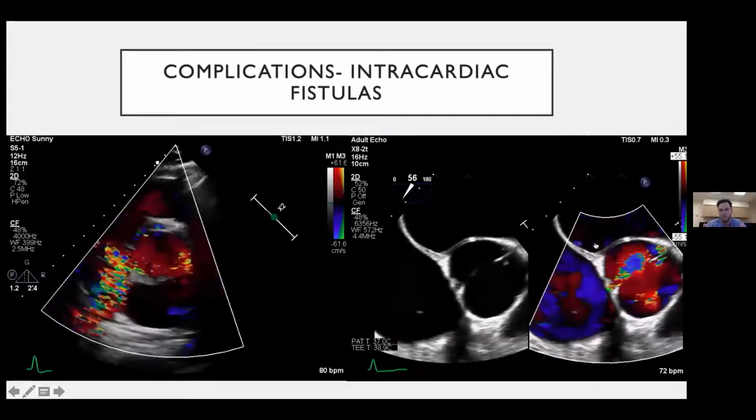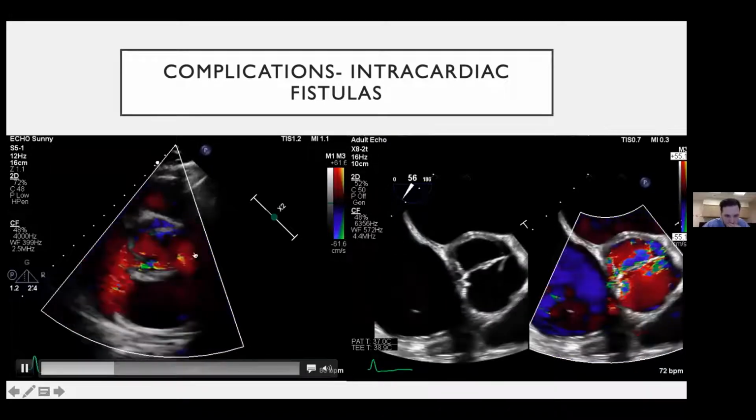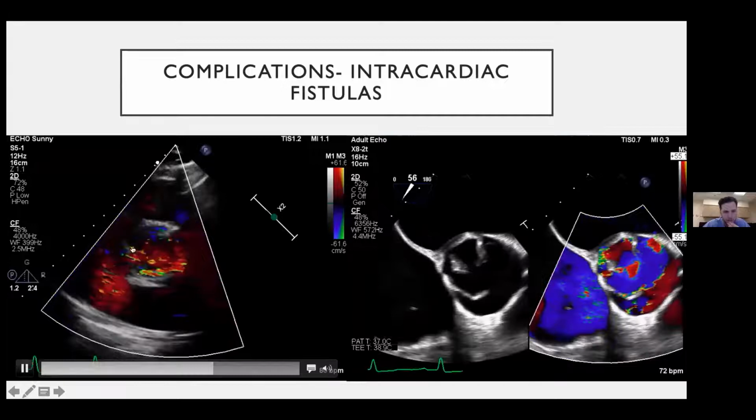Mike, I'm just wondering if you can use your mouse to point out where the fistula is, where your mouse was on the TEE, which was just a bit more clear, right? Yeah, for sure. So this is it right here.